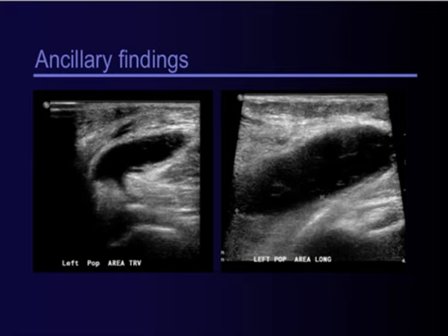But the one caveat is that in a small proportion of these patients, synovial sarcomas may present with the same appearance as a Baker cyst. So we prefer to image what we think are Baker cysts with the three landmarks present. Now, a Baker cyst is nothing but distension of the gastrocnemius semimembranosus bursa.